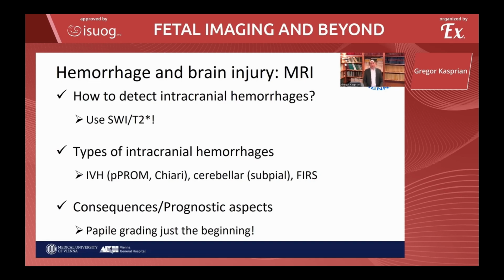I showed you the images on which it is based, and I think that our images today, either ultrasound or MRI, are much, much better, and we need a system-specific, anatomy-specific scoring system taking different structures into account. Tractography, of course, is a nice tool to also evaluate motor involvement in these cases.